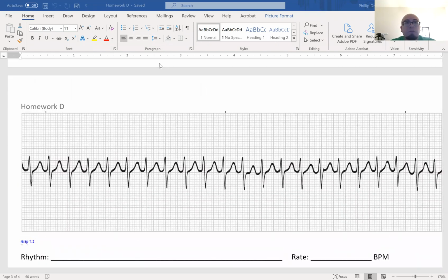Next one here. Check for regularity. You see that you're regular. All the way across, double check. Check it over here. Quite regular, right? Okay.